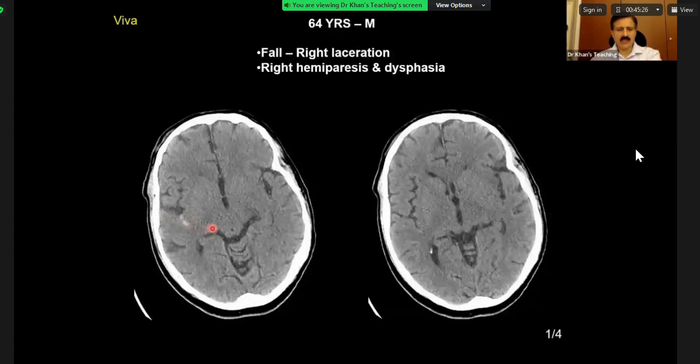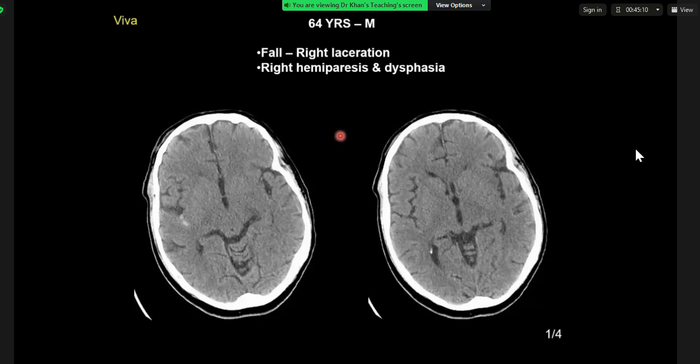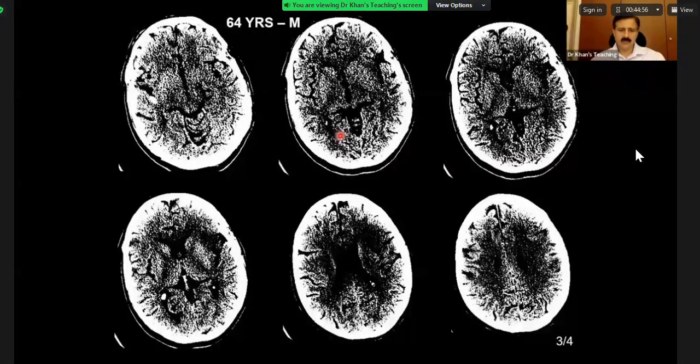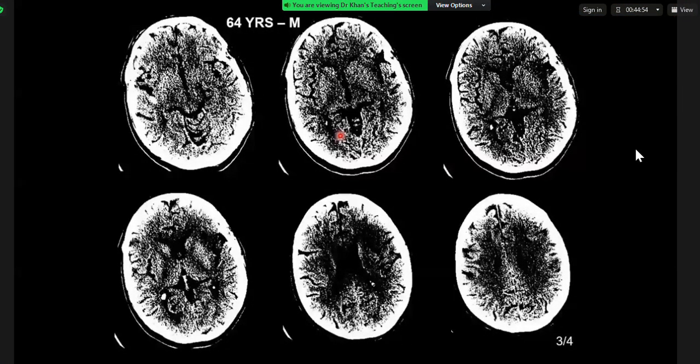There was subarachnoid hemorrhage in this case. Is there an acute infarction? Right-sided hemiparesis means look at the left. So I'm looking specifically on the left side now at the basal ganglia. I have an impression that is. So I'll give you a stroke window. Yeah, sure. So again, in the left insular region, there is an insular ribbon sign demonstrating an acute infarct.